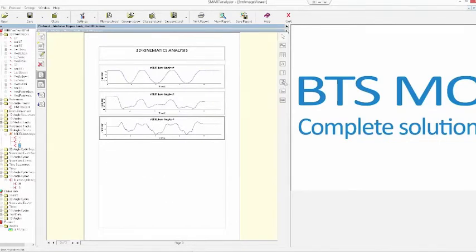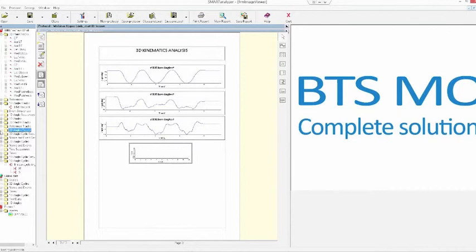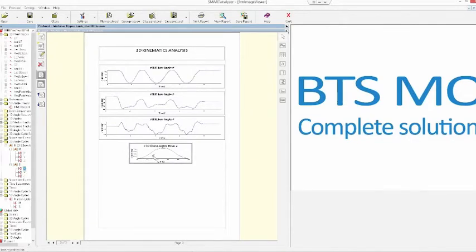Okay, and now I want to add another box that will contain the mean normalized gait cycle. So these variables are contained in the 3D angle cycles. Okay, and imagine that I want to use just the first, the flexion extension component, and I can add the average, the mean value, and the standard deviation. Okay.